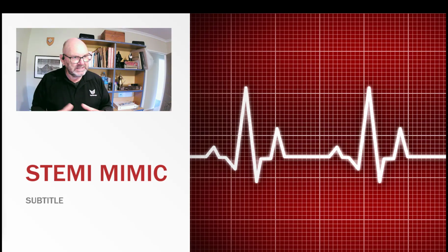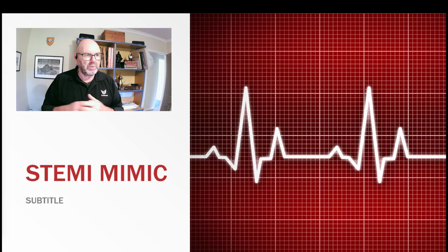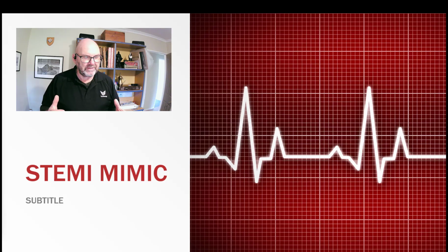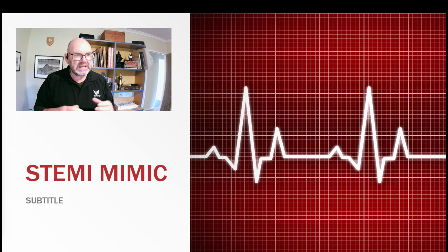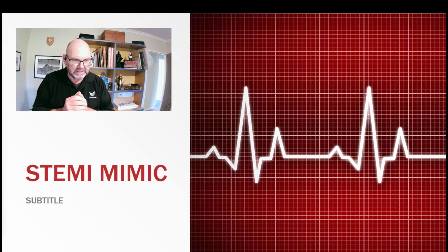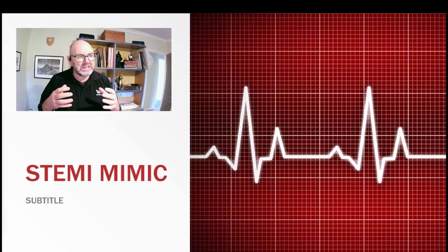So STEMI mimics are ECGs that present with repolarization phase changes similar to those that we expect in acute cardiac syndromes. So typically these are going to present as ST elevation or T-wave changes that are similar to those that are associated with a STEMI. So the role in considering STEMI mimics is to avoid code STEMI activations when these mimics appear, and it's an important part of paramedic practice because it prevents unnecessary and potentially harmful treatment when it isn't indicated, and it also reduces the opportunity cost at PCI facilities.